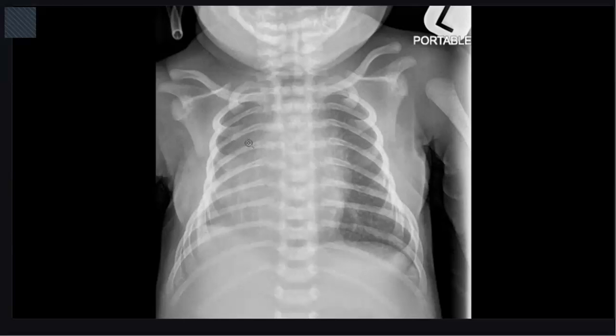The possible causes for pulmonary hypoplasia may be any compression effect on the bronchi from outside, like diaphragmatic hernia, CPAM, or sequestration, but they are not present here. So maybe decreased pulmonary vascular supply, like any cardiovascular anomaly, hypoplastic right heart, hypoplastic pulmonary artery, scimitar syndrome, or any vascular cause.